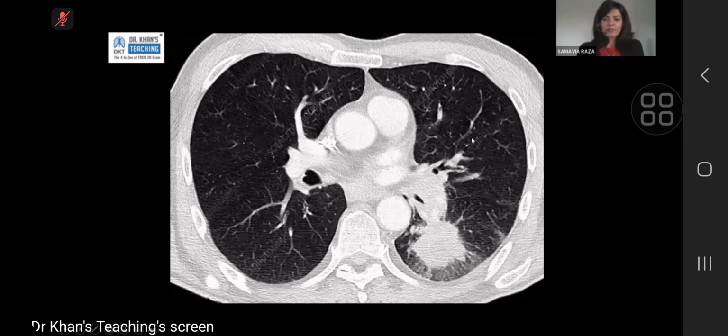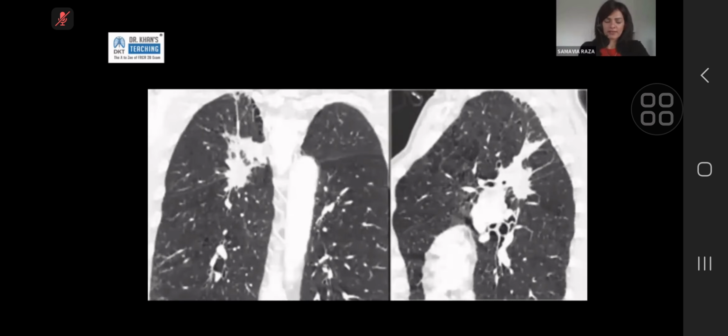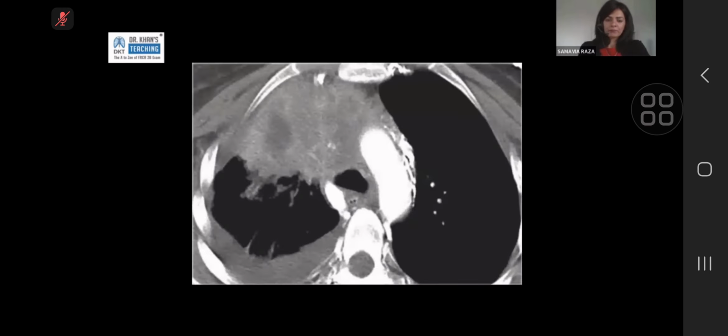Radiologically, when somebody says lung cancer, you automatically imagine something like this. You expect a mass lesion that has clearly spiculated margins, and that's very easy to diagnose for the most general radiologist. But the tricky part comes when you come to different morphologies of lung cancer. This, if it wasn't for the fissural crossing or the fissural involvement into the two lobes, on certain slices, somebody may, in speed and haste, dismiss this as post-inflammatory atelectasis, because you see the lesion crossing the fissure, you are suspicious that this is lung cancer. But this is something that can catch you out if you're reporting too quickly.